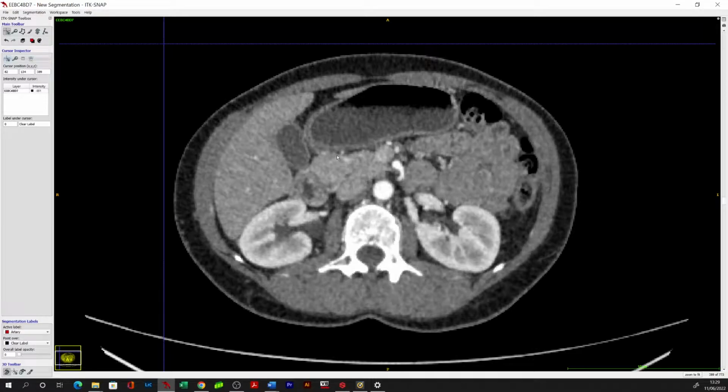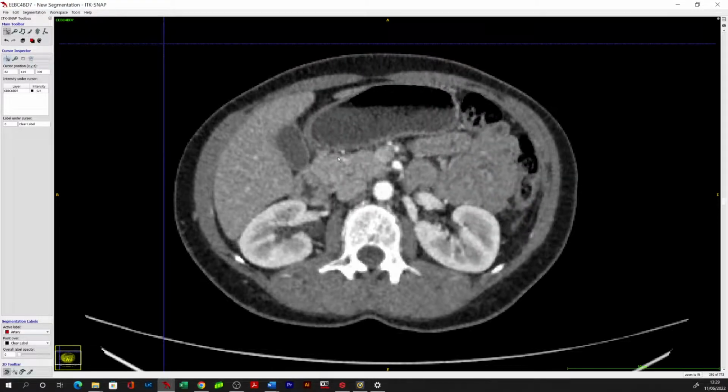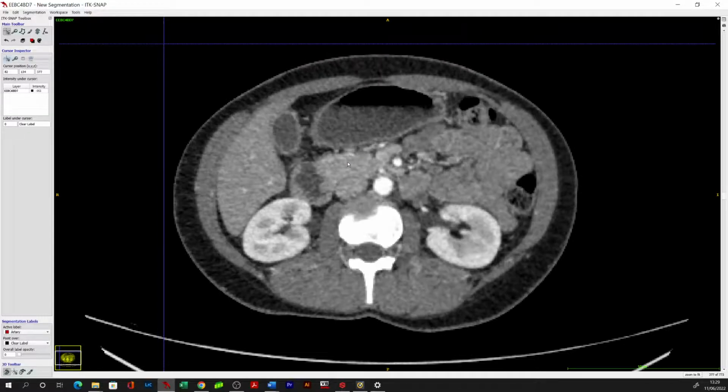There's likely something going on, so you can see there's just a slight movement, and it's very difficult here because you've got no portovenous contrast. So whilst the arteries do make the arterial segmentation easier, they make the venous segmentation much, much harder, which is why I typically prefer the portovenous phase. But we sometimes do not have the luxury of a choice.